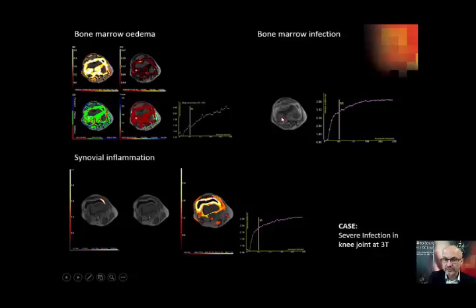But the bone marrow lesion, which surrounds the periphery of that osteomyelitis, will give you a high bone marrow signal on the static or fluid-sensitive sequences, but a less steep enhancement curve. This opens up for understanding or potentially using the flow curve, the DCE-MRI curve, to separate the reactive or repair tissue from inflamed or infected tissue.